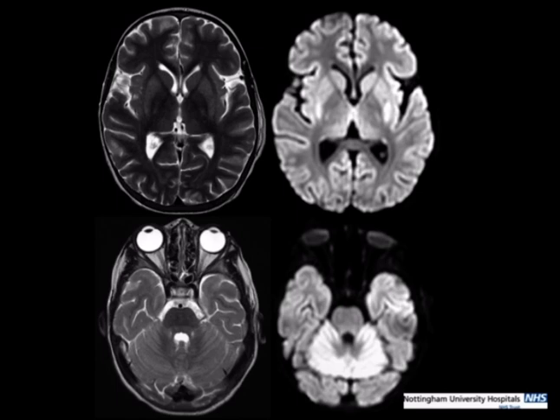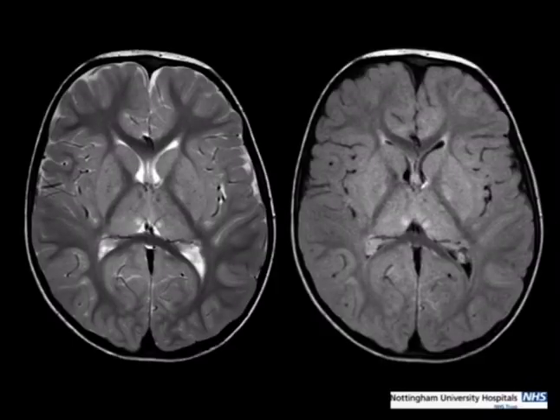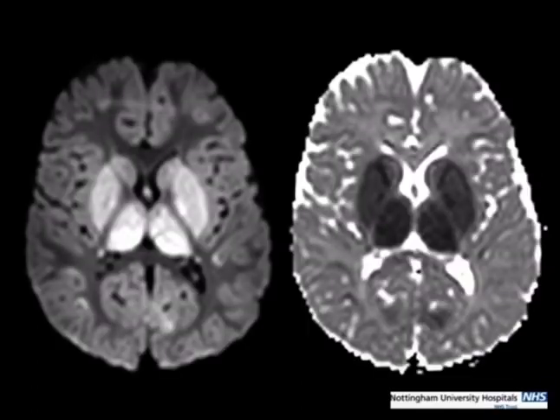So this is a short but profound hypoxic ischemic injury. Another short and profound one, this is axial T2 and FLAIR. I think it'd be pretty easy, unless you had the correct history, to go straight past the findings. But when you look on the diffusion-weighted imaging, you can see this is really obvious deep grey matter hypoxic ischemic injury involving striatum and thalamus bilaterally. Also, I don't know if you can see, there are a few little pockets at the base of the sulci as well. And that seems to be an area that is particularly susceptible to hypoxic ischemic injury.